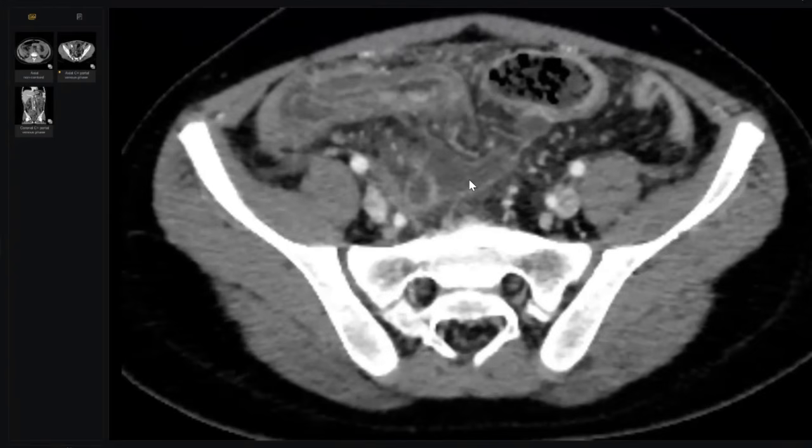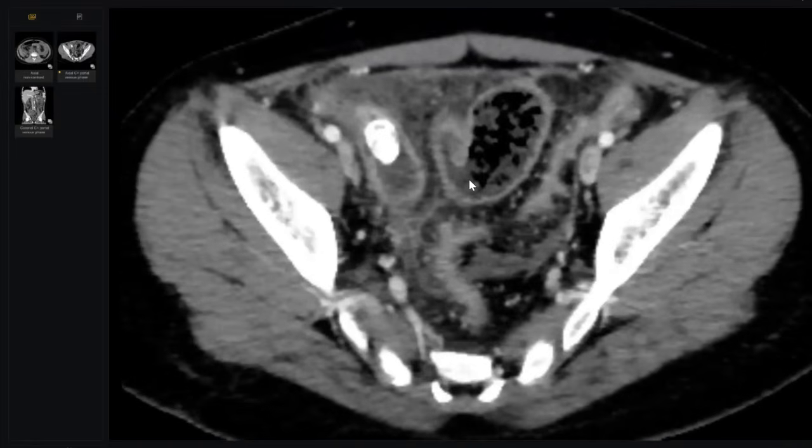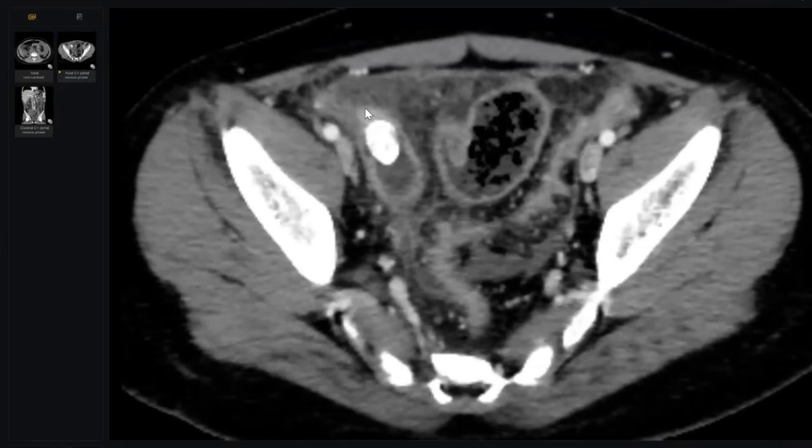Final diagnosis? So this is an inflammatory process involving a long segment of the bowel and causing thickening and stricturing of the small bowel loop, likely the ileal portion, and is causing proximal small bowel obstruction. Okay, but what about this structure?